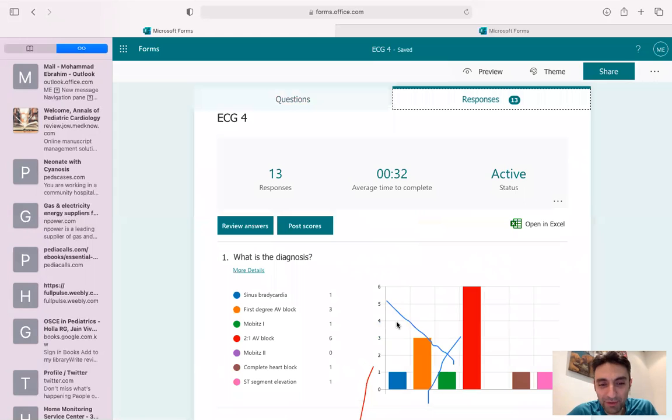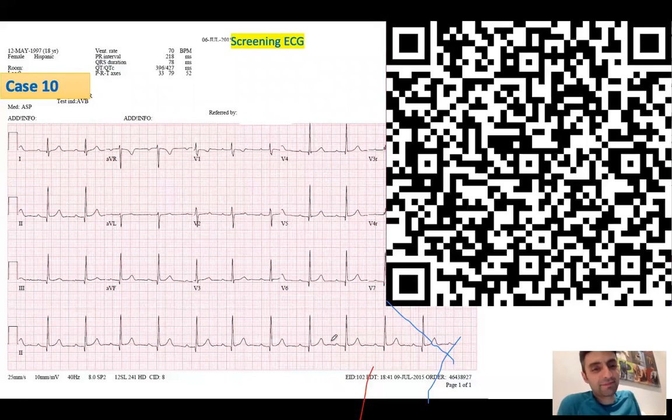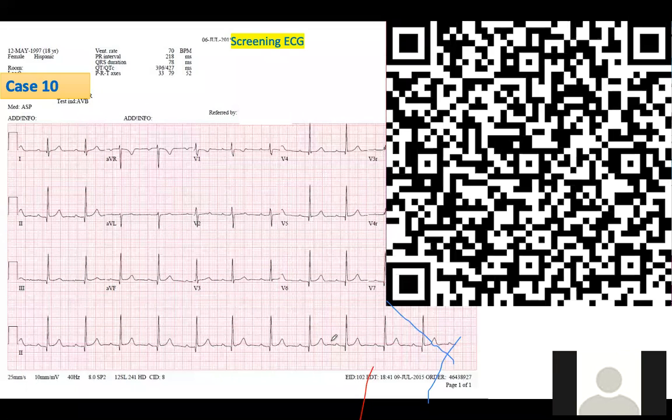Is this reasonable for ECG 4? Yeah, okay, that's strange. Then 6 said 2-to-1 heart block. Who said 2-to-1 heart block? Someone said 2-to-1 heart block. But this is fixed prolonged PR, first degree. First degree, these are regular, fixed, prolonged PR.